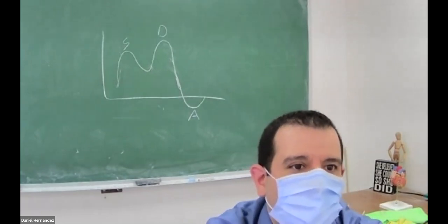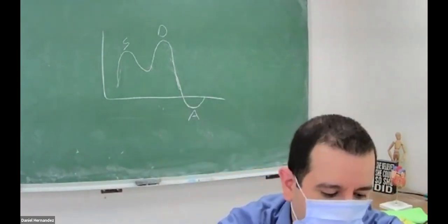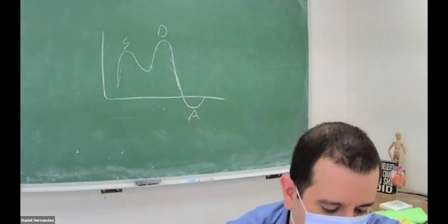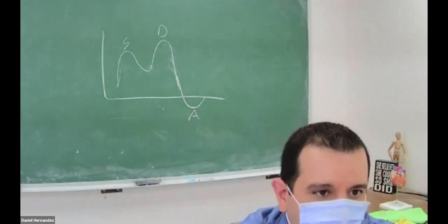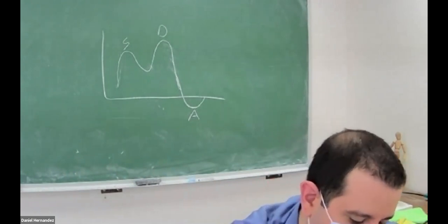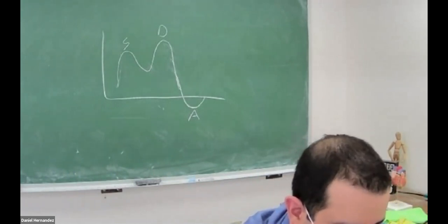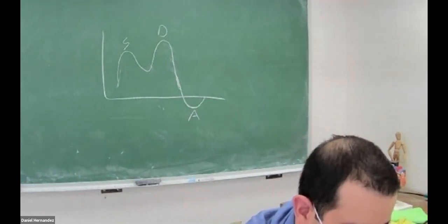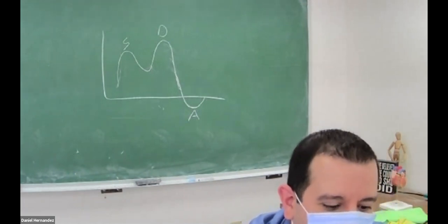So that dissection now tears off the intimal wall, is now covering the right sinus of Valsalva and not allowing blood flow into the right sinus, which causes the wall motion abnormality because blood flow is not getting into that right coronary artery due to that dissection. Not good. So you can break these down.